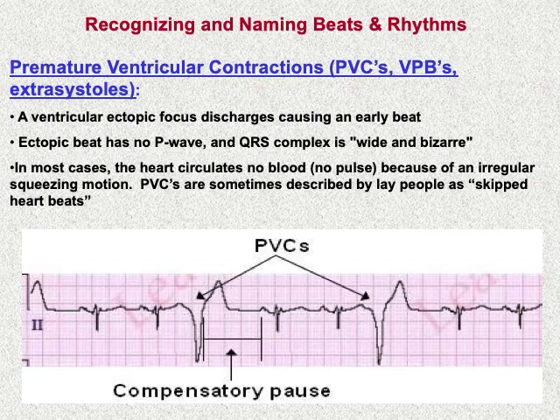And usually, because the ventricular contraction here is not effective, the patient will feel it as a skipped heartbeat. This one is usually symptomatic. Here there is no pulse, and then here will be a strong pulse. So either the patient will feel a skipped beat or a strong beat here. So usually this is symptomatic, so it is easy to diagnose. This is PVCs.